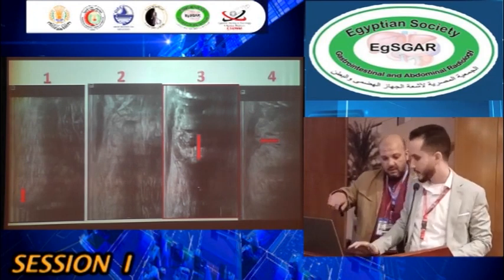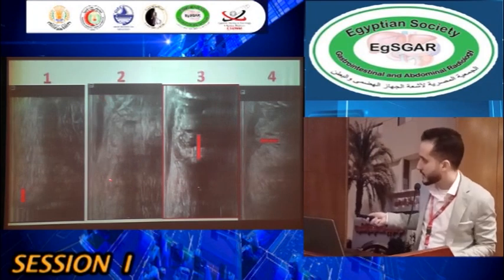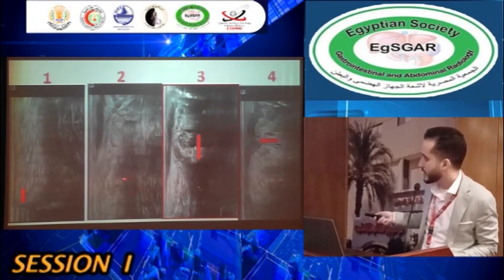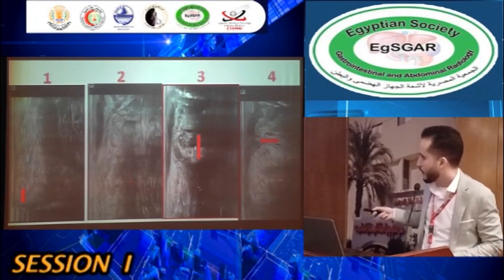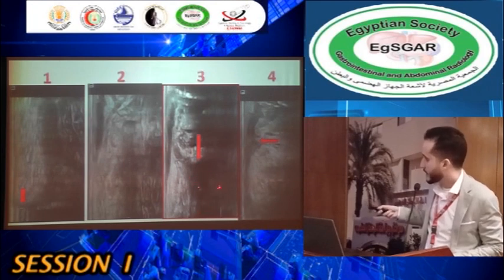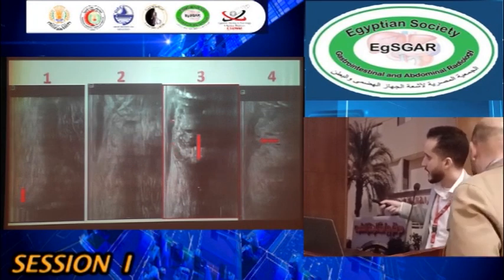This is the internal anal sphincter, and this is the external anal sphincter, and this is the hypoechoic tract extending in the subcutaneous anal space. In image number 3, we found that the hypoechoic tract extends to a hypoechoic collection with two secondary tracts, two limbs. One of the limbs is seen traversing the external anal sphincter and the internal anal sphincter.